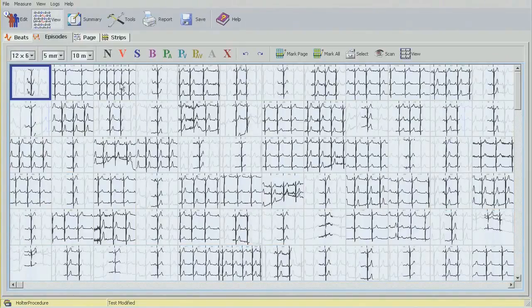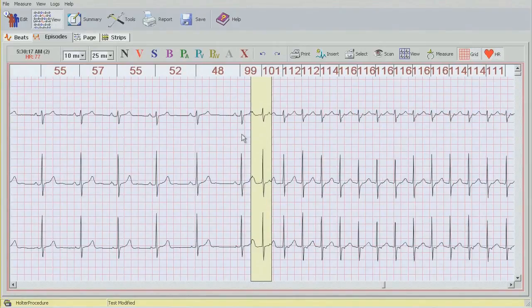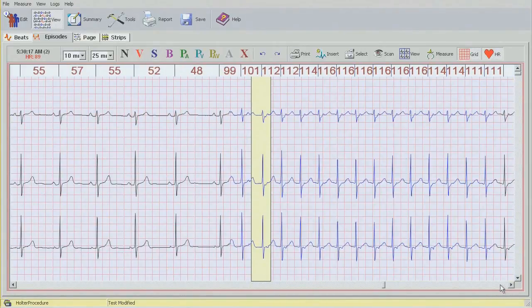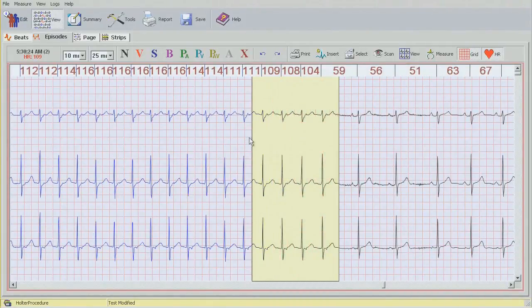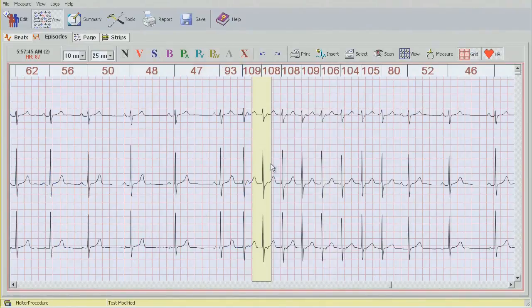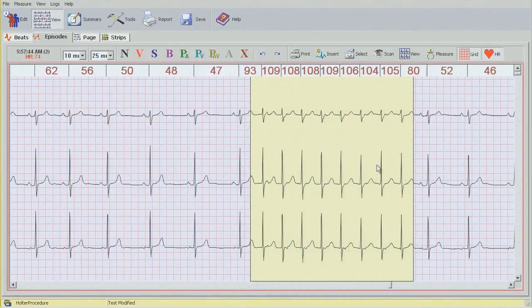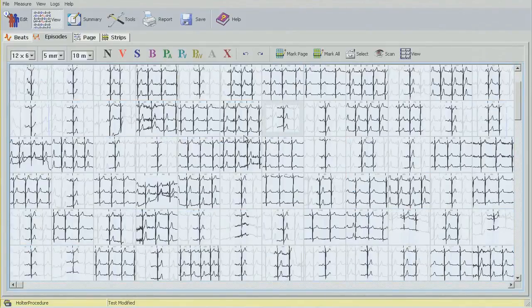Again, there's another run here, or at least what it seems like to be. And sure enough, just going to change this as well as the last 4 beats. And this brings us to the next episode, and there's another run here, which I'm going to label and go back.